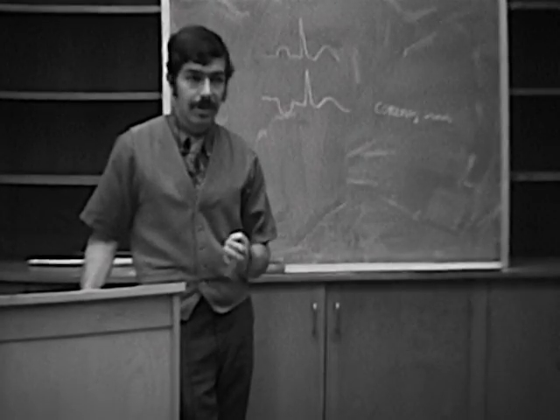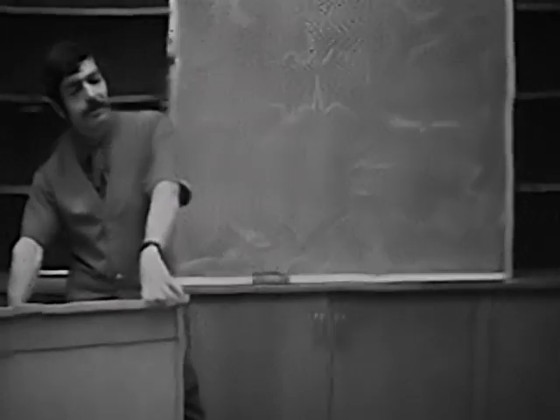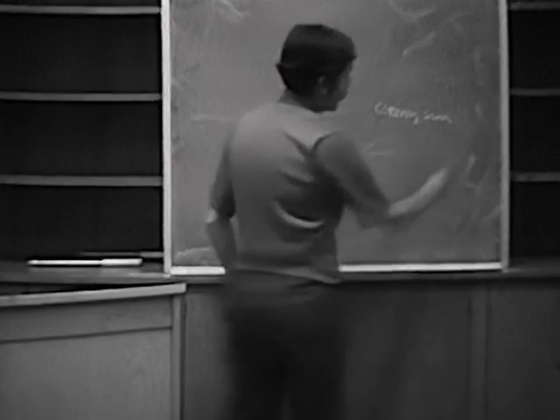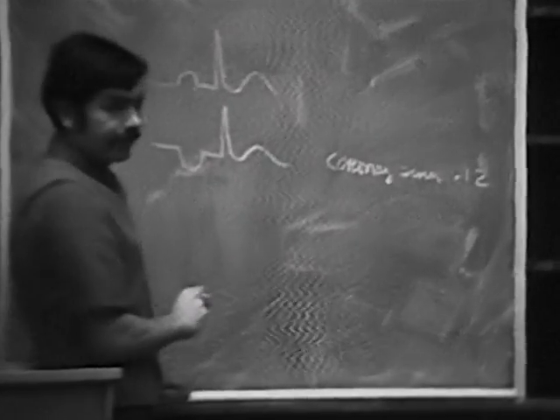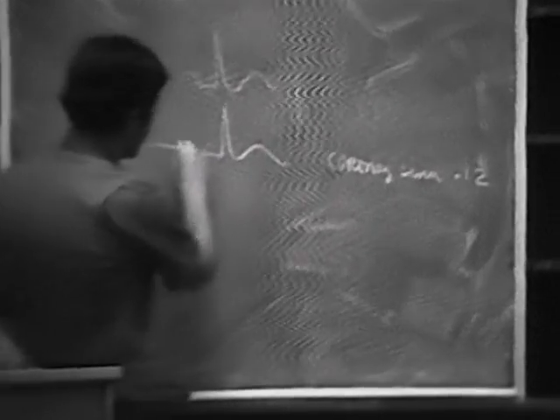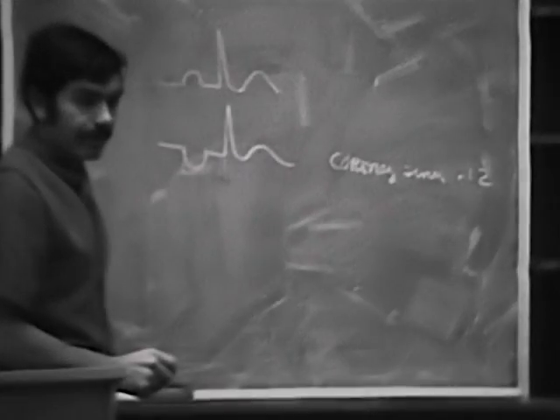It's the PR interval, right? What's the lower limit of normal for the PR interval? 0.12, right. 0.12 is the lower limit of normal. So, if it's greater than 0.12, you're in the atrium, right? So if you have an inverted P wave and the PR interval is greater than 0.12, it's an atrial mechanism or a coronary sinus rhythm, right?